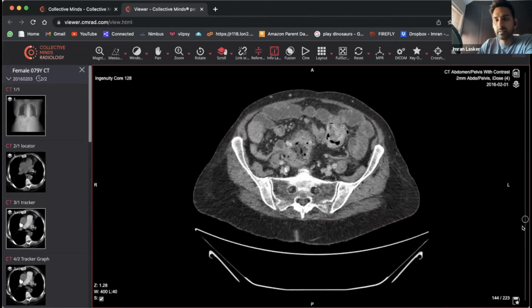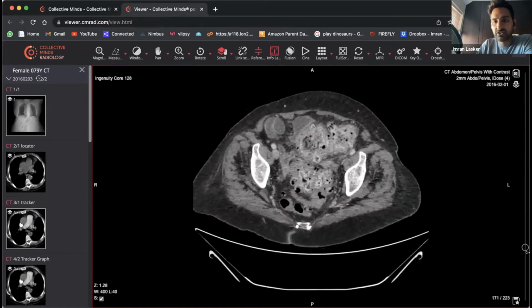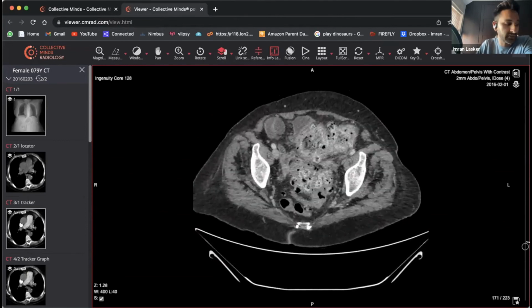So what can happen to patients, usually if they are elderly, is... yes, perfect, well done. Exactly right. So you picked it up, you know your stuff. So this is exactly what you said, stercoral colitis. What can happen is that fecal impaction, lots of feces just sitting there, can actually start resulting in inflammation itself. It starts to cause something called stercoral colitis. And stercoral colitis is where you've got impacted feces within the colon lumen and there's subsequent inflammation.